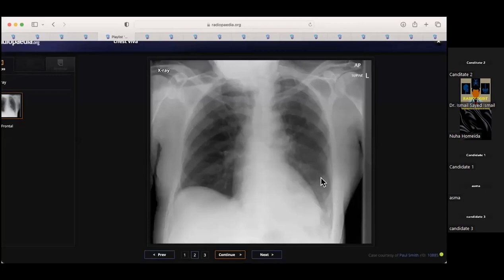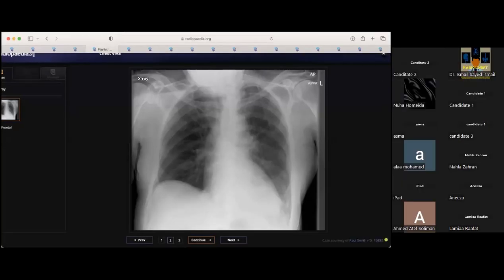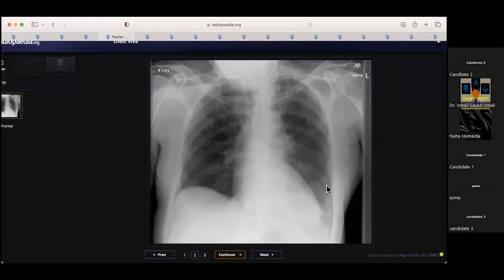Here there is just a rib fracture. I didn't give you the history of trauma, but that's just what's given in the history. It's shortness of breath. So always read what's written on the film. But this is a deep sulcus sign with a fractured posterior rib.